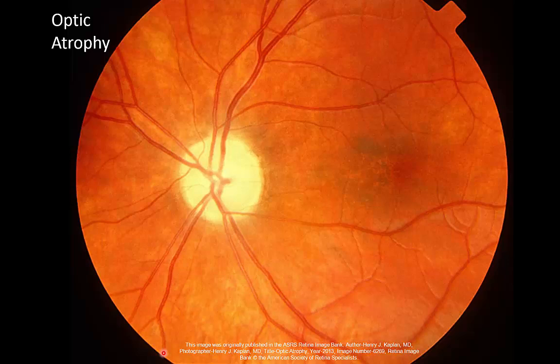Here's another example of optic atrophy. It looks like the moon. And I think you can agree it looks like the moon. You can actually see your central retinal vein quite well right here. But again, we can't really make out where the cup starts and the disc starts as well. So this is optic atrophy, which is a late stage phenomena.